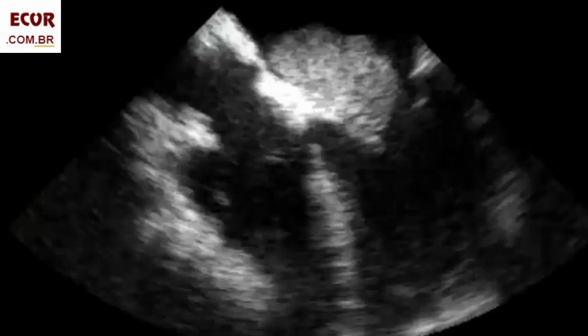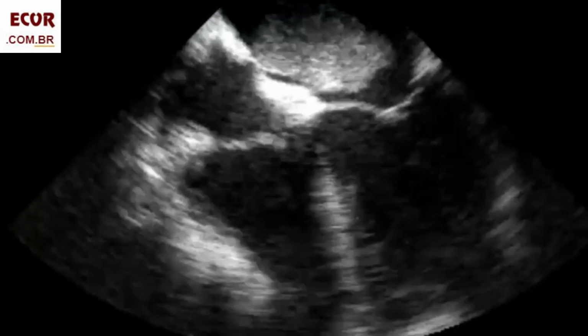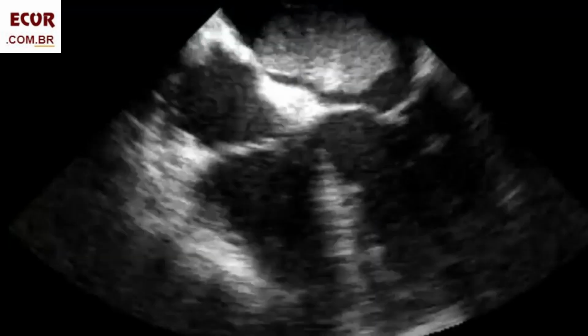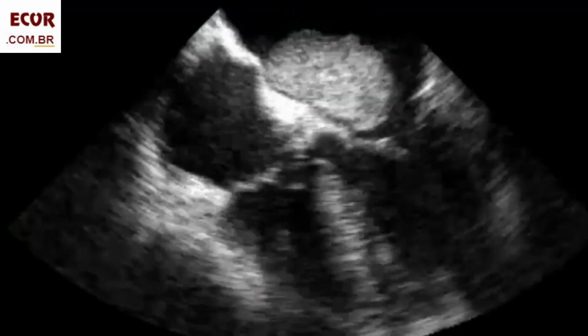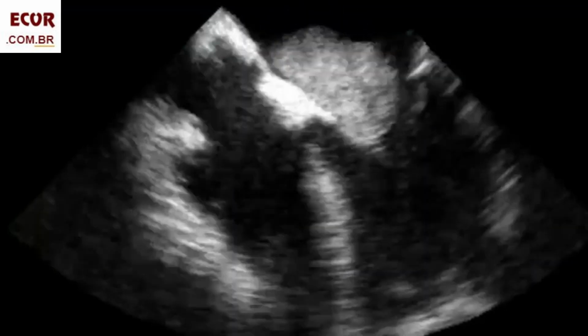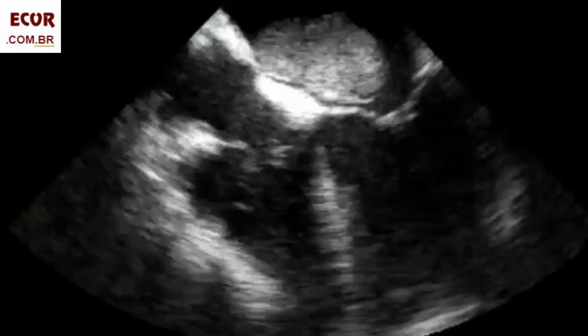Another example of a left atrial myxoma, very close to the mitral valve. The TEE in this view does not show, but it was adherent to the interatrial septum. Notice that it might as well be attached to the base of the mitral valve. When the pedicle of the tumor is too close to the mitral valve, it may be difficult to be sure it's not attached to the anterior leaflet, even by transesophageal echo.